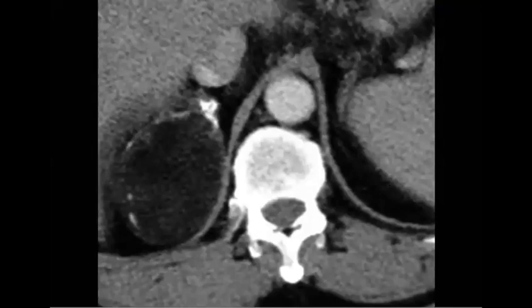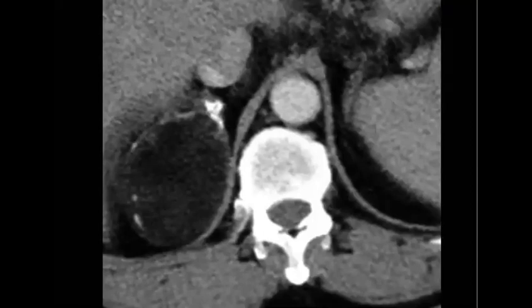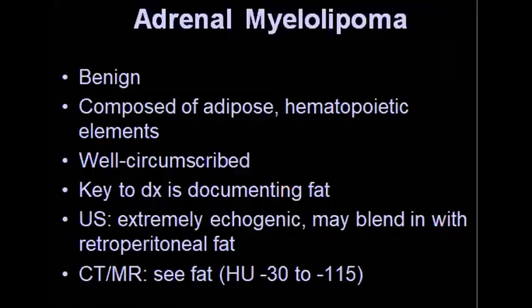Then we reach this one, and when you find it, you will suggest some differentials. So what would it be? Nermine. So why did you mention that it will be myelolipoma? Perfect, because of the fat density. Perfect. So is it a benign or malignant lesion, the myelolipoma? It is benign. Perfect. So fat and calcification, well circumscribed, and this is the typical adrenal myelolipoma. Yes.